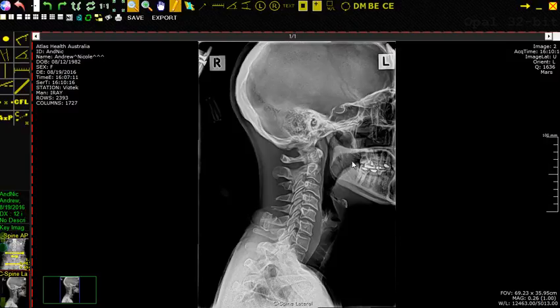So if we're looking at the x-ray, this is the right shift and this one here is the left shift, then if we're looking at the right shift, we want to make sure that this is the end of the x-ray right here. And if it was a left shift, we try to get it as close to the spine right up through here so that when we put the 2 images side by side, it's very easy to see.